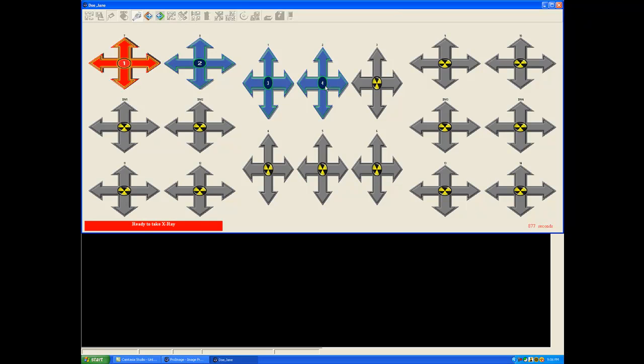So if you miss your last shot, another trick would be when you make this selection, always choose one additional shot, one shot more than you intend to take. You don't have to take it. You can always stop by hitting this. But what it will do is if you miss your last shot, it gives you a chance to return and retake it. So here I hit the stop button, and we are now back in the template.